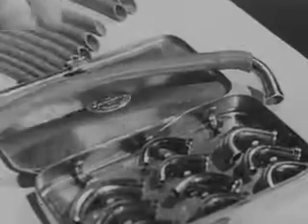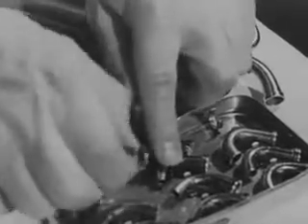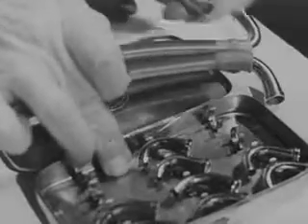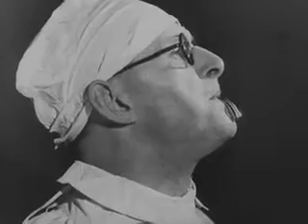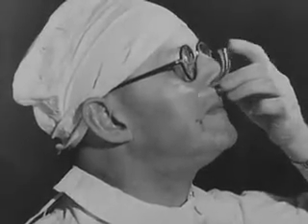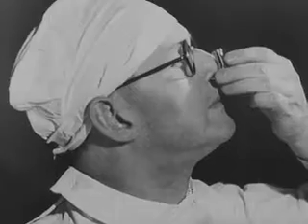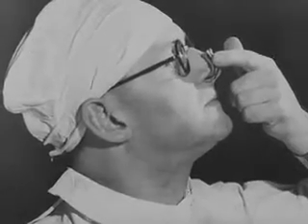Lastly, a series of metal connections graduated to fit the different sizes of endotracheal tubes. There are two types, oral and nasal. The oral type is a wide angle which fits snugly to the chin, and it is long enough to prevent the rubber tube being bitten by the patient's teeth. This type should never be used in the nose, as it would project too far and tend to cause kinking of the rubber tube when the towels are applied. The nasal connection, on the other hand, has a sharper curve and projects as little as possible from the patient's nostrils.